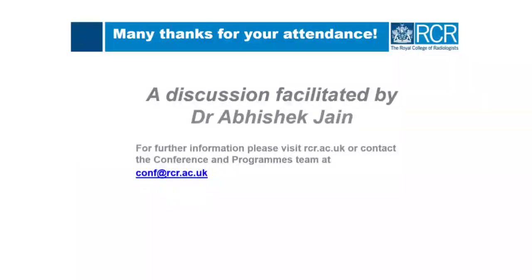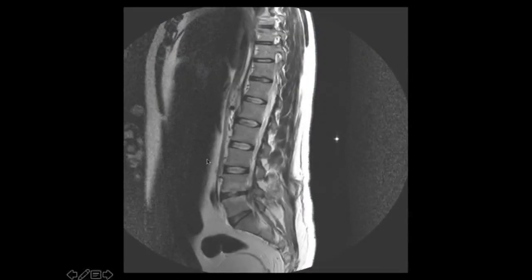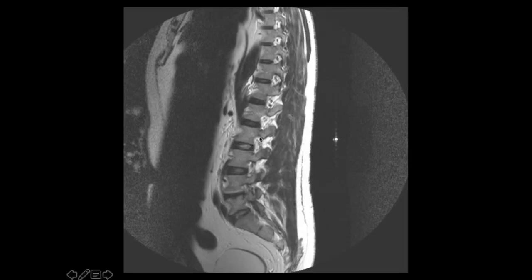The explanation for that is, if I can bring it back to the lumbar spine again, this is just an example of the lumbar spine. If you see the nerve exiting, it's exiting vertically, but it also swirls around, and that's the reason why you don't see the entire nerve on one sagittal image.